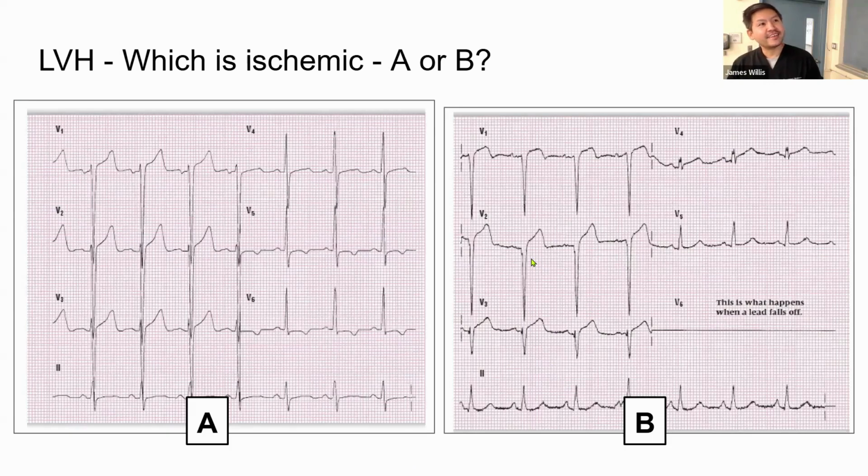What about here? This textbook has a good sense of humor. It's probably where the ST elevation is, too. A or B? What do you guys think?